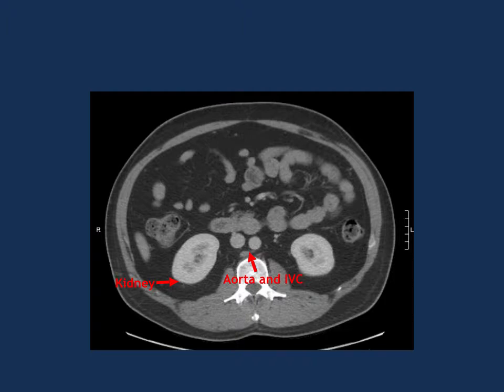But in general surgery, a lot of ours is a little more delayed because we're looking at the bowel, the organs, and the portal venous structures. An angiogram phase is 30 to 45 seconds after contrast administration. If you're looking at appendicitis, you'll get a CT scan about 90 seconds after contrast administration, so the contrast has diffused out from the arteries and gone into some of the veins. On this image, the contrast has diffused even more than 90 seconds, so the aorta and the IVC are identical in their enhancement. Interesting. Okay, let's move on.